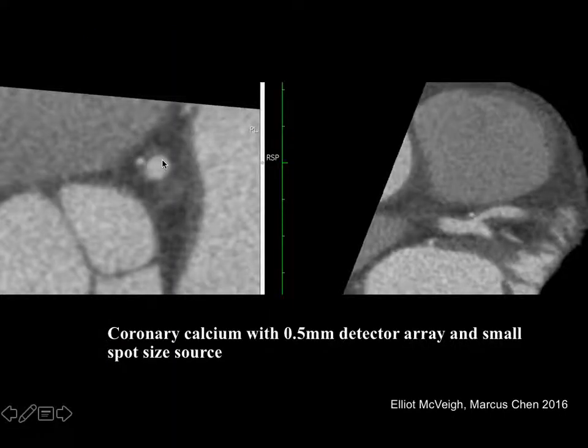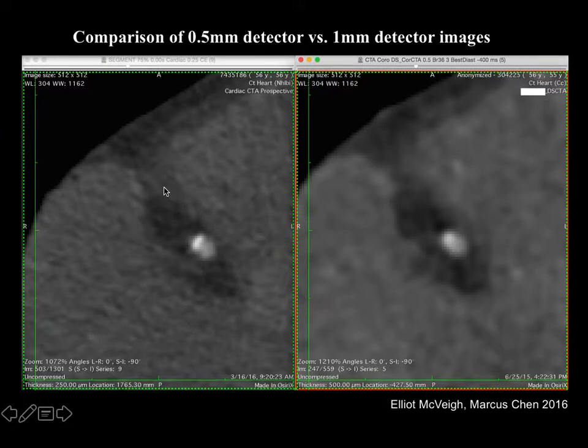So here is that tiny piece of calcium imaged again on this scanner, and it looks to me like you've lost that whole sort of feeling like there's a bulge. It looks like this is a soft plaque that's growing into the vessel, and it has a sort of flat space here. Here's the soft plaque, the coronary calcium, and the lumen here.